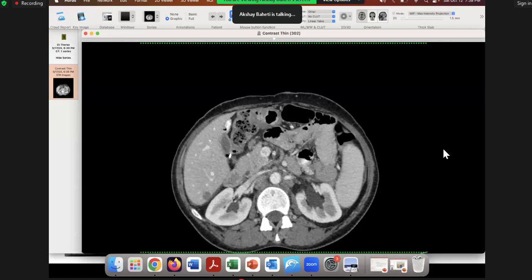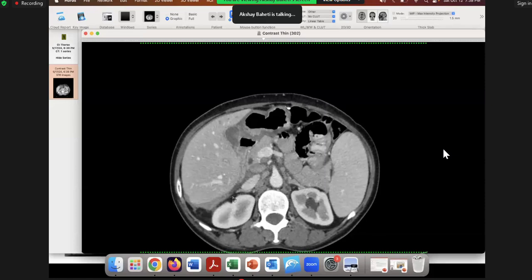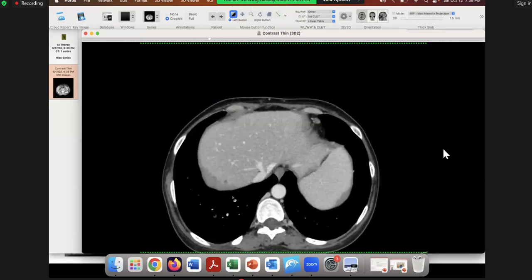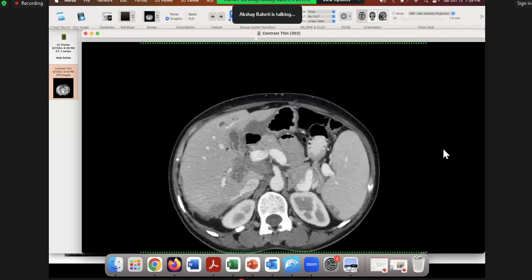It may be invading the liver, but it's a surface deposit, because then the patient is not palliative, it's still a curative stage 3 patient. So in this case, I would call them all surface. And I would say there are some lesions like this one and this one which could be cysts. I'm not certain. They are indeterminate, and I'll put a probe and confirm.